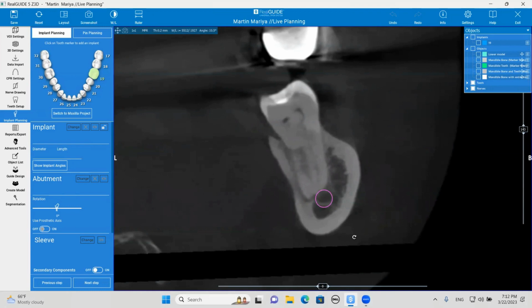So even though this is hugging the roots of the teeth, the anomaly here is the actual root length. If we look at the actual nerve trunk, it is going to be what we call a type 3 nerve because it does hug the inferior border. That is always a very friendly nerve to us because it will be in the lower 1/3 of the mandible, and that will give us more available bone for implant placement.